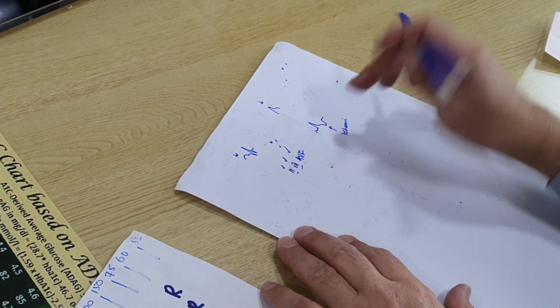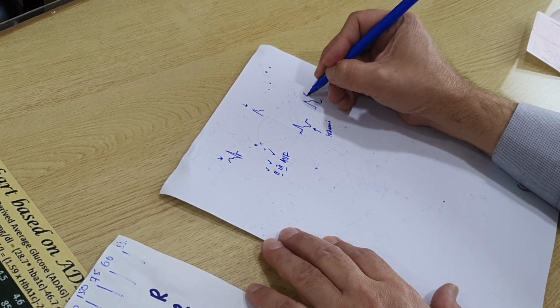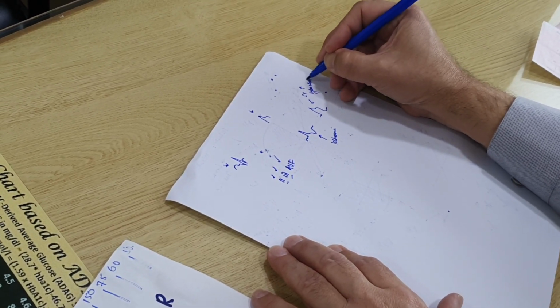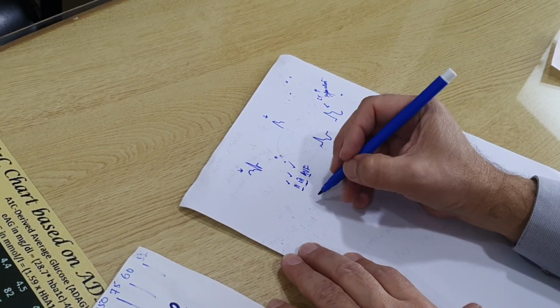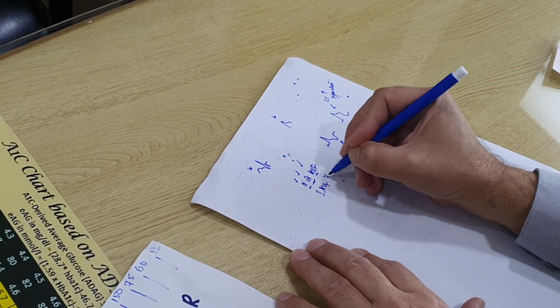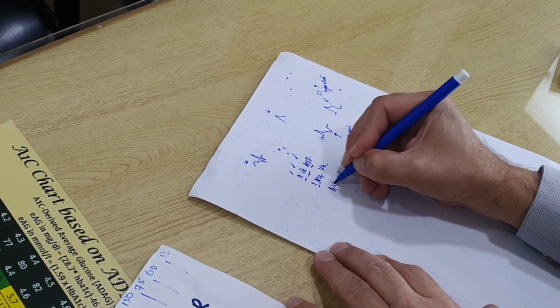If there was infarction in the inferior leads, you would get an ST segment elevation. So the ST segment would be elevated, and this means infarction. And this has to be present in all three leads, 2, 3, and AVF. If it was lateral wall, it will be 1, AVL, V6. And if it was the right side, you'll have to look for lead AVR.